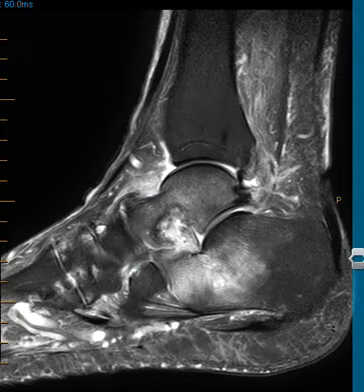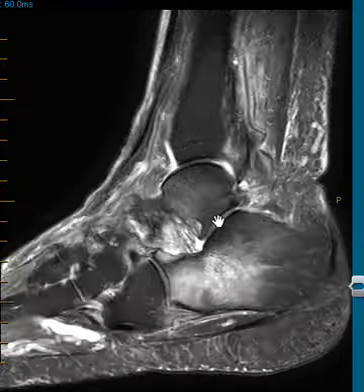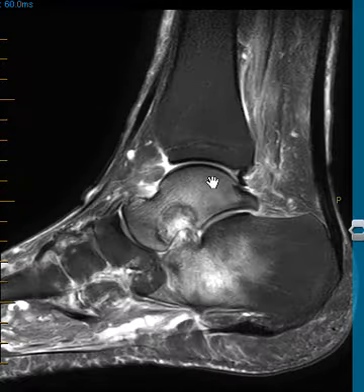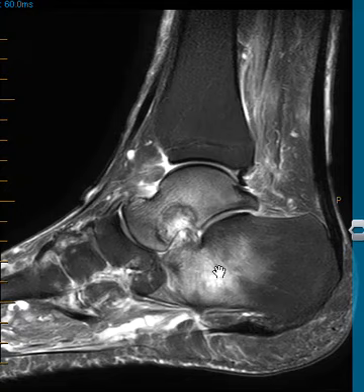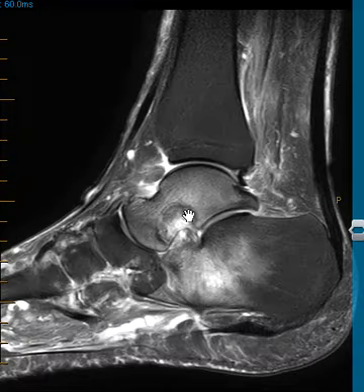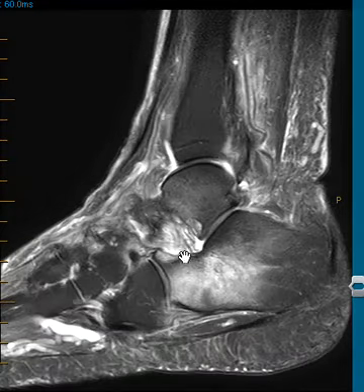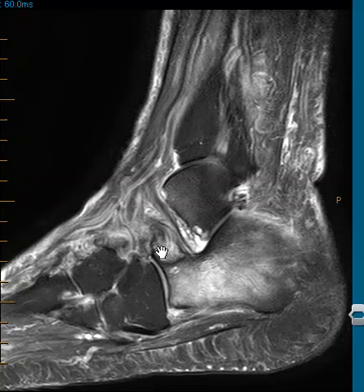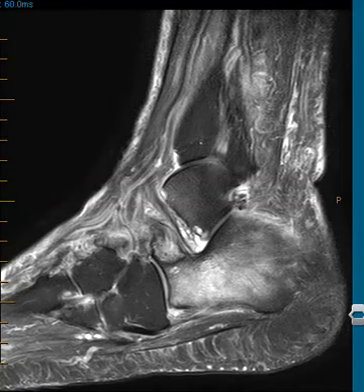If we put up the T2 weighted images, it has a kind of a classic appearance of bright signal here centrally, and this marrow edema all around the margins, sharp margins where the bone is chronically eroded. And also, if we look at the ligament attachments right here, we see a ligament coming down. We see this broad appearance. This looks right at a ligament attachment. So this is an enthesopathic process, an enthesopathy, because again it does go to the ligament attachment and chronically erodes.